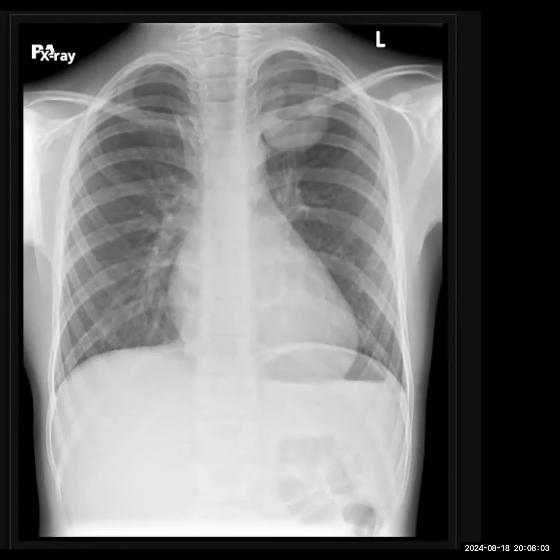So, what are your differentials from the X-ray? My first differential would be a consolidatory focus, an infective focus with some areas of cavitation centrally. And my second differential would be that of something more sinister, probably a bronchogenic carcinoma, since it's in the apex of the lung as well.